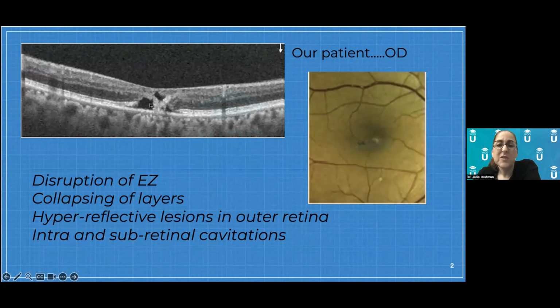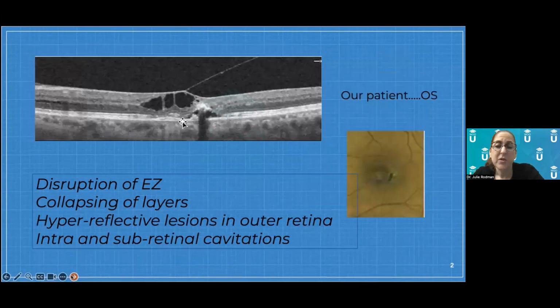If you look at this patient's OCT, this was when we started, that ILM drape. This was the kind of involvement of the photoreceptors in the outer retina. This here is pigment plaquing. So this correlates with this OCT scan. And if you looked at this and you thought it was AMD, hopefully when you did the OCT scan, you could appreciate that this appearance does not go along with what macular degeneration would look like. It actually is pretty pathognomonic for MacTel.